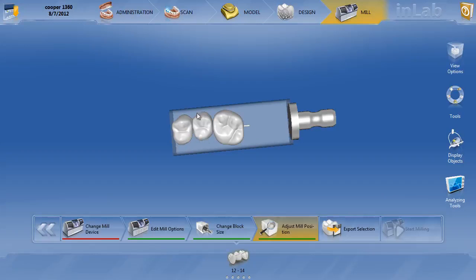Now the reason it step mills in the regular mode is because when you use the 12S burrs, it needs to remove some excess on the outside in order to reach some of these hard to reach places with bridges. So go ahead and stack mill it if you need to avoid the step milling. So hopefully that helps. It actually was a really nice job with this case, so it just needed a couple of tweaks and it should be great.